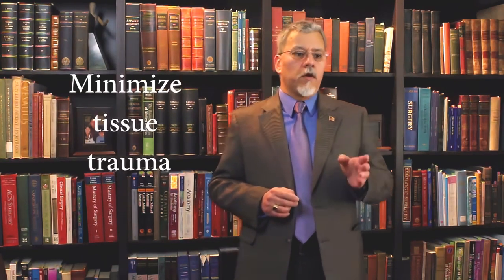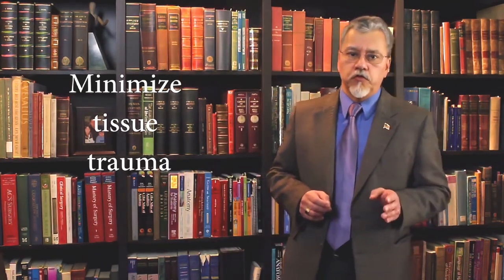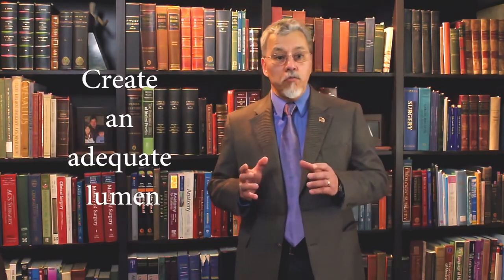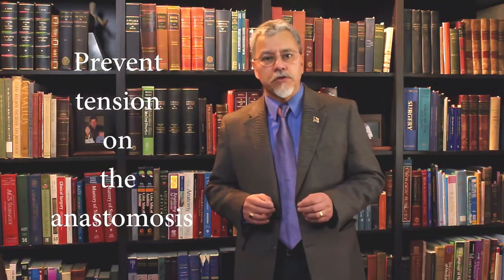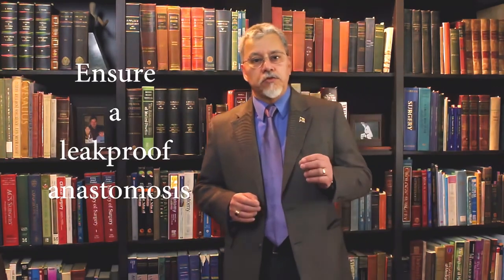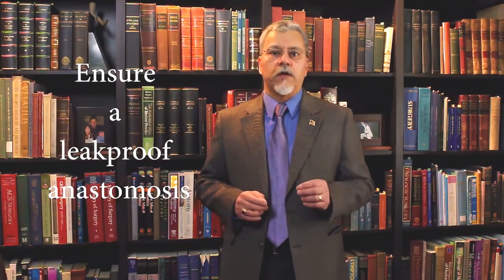Now, there are several clinical considerations for tissue management and a good anastomosis. These are, in no particular order: 1. To minimize tissue trauma, to provide good blood supply, to create an adequate lumen, to prevent tension on the anastomosis, to allow adequate tissue margin, and last, to ensure leak-proof or watertight anastomoses.